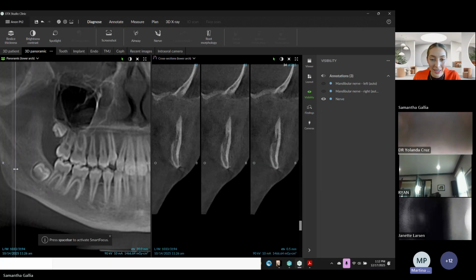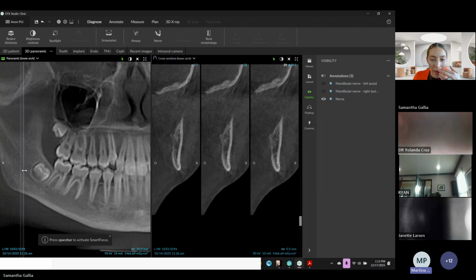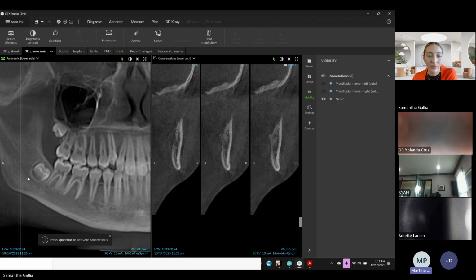Yes. It sounds like people in this group place implants. And so another thing to note is when you are struggling to draw a nerve, mentally make a note that the trabeculation is probably sparse. And so primary stability may not be ideal as well.